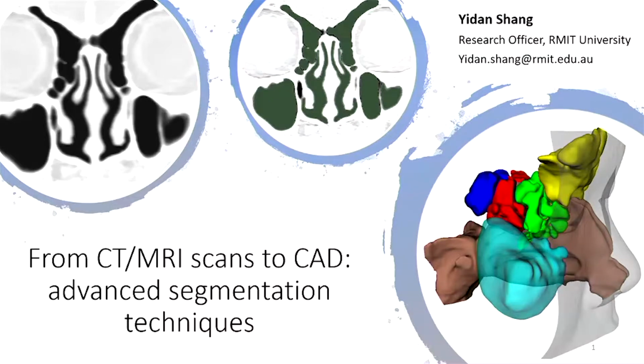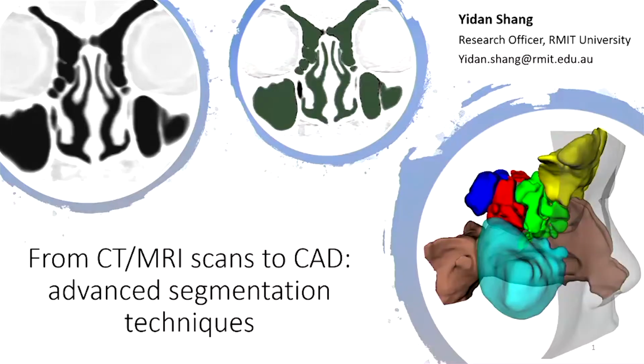Today, I'm going to present some practical strategies to segment the nasal cavity from CT or MRI scans to a complete nasal cavity CAD model.